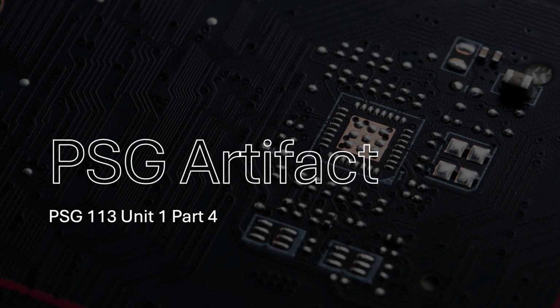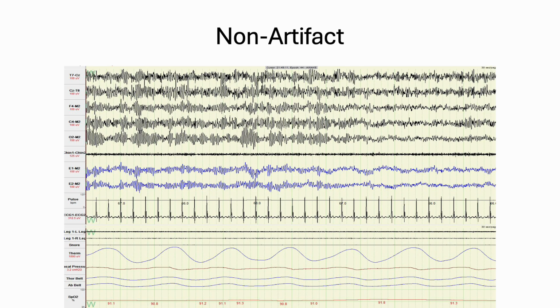There are many sources of artifact, but they're actually pretty easy to figure out if you think about it for a little while. So, first, let's look at a study that is pretty clean of artifact. Let's start with the EEG.